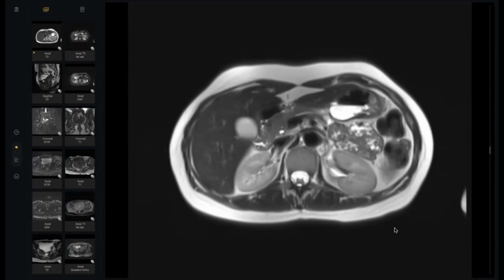Okay. Yes. What happened here? Here. In this slice. In this slice. Can you scroll a bit up more? I'm trying to look for the spine. No. At this slice, look at a retroperitoneal organ. Sir, there is... I'm trying to look for any vascular abnormalities.